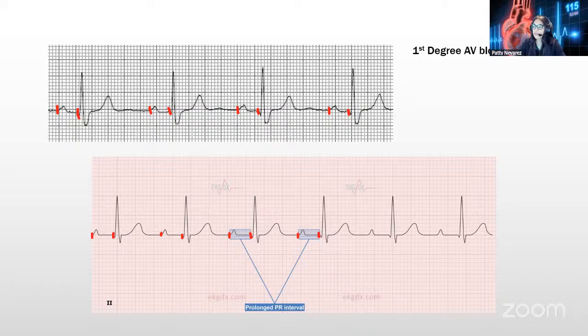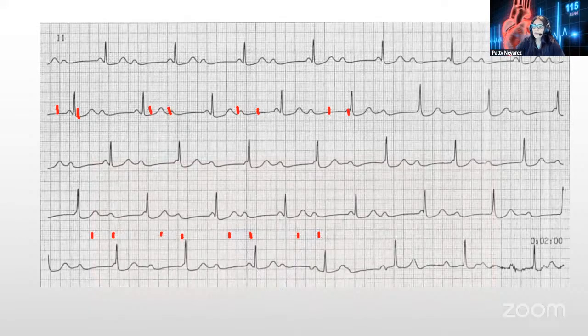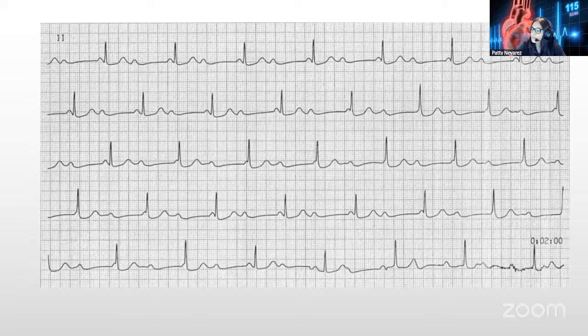Okay, I have another sample. Let me erase all my beautiful notes so we can see a little bit here. Okay, let's take a look. What can we see here? This is a full strip. This is a lot of seconds, but it is the same as lead 2, as we can see here at the top, right? It's lead 2.